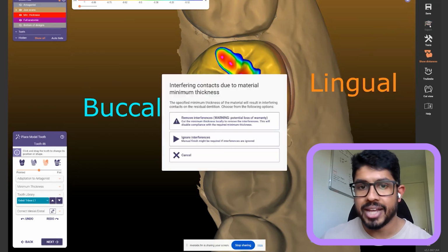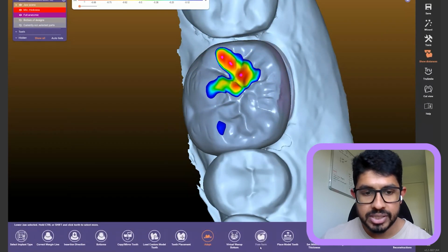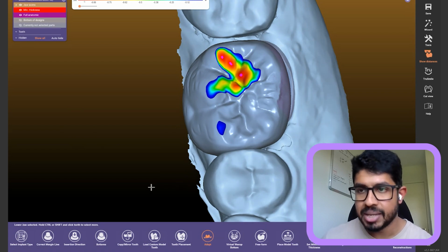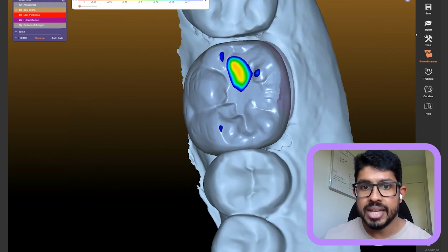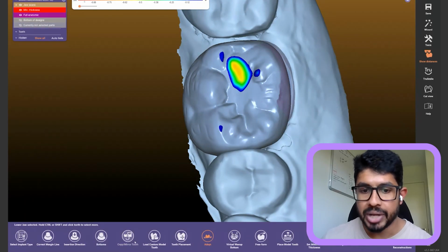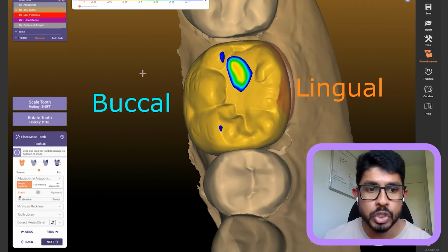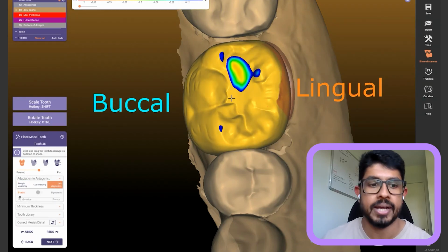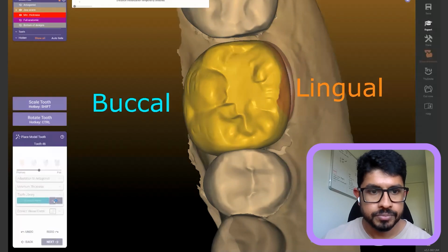But under expert mode, you can see all of these tools that pop up over here, which are essentially the exact same tools that were present in the wizard mode steps. It's just that I have all these options down over here because I know what the next step is going to be. So I don't normally work in wizard mode, and that's the reason for it.